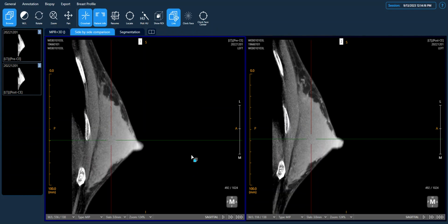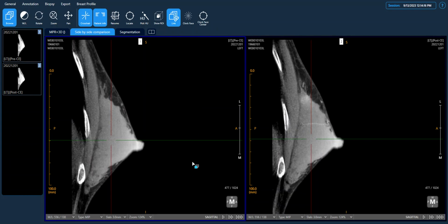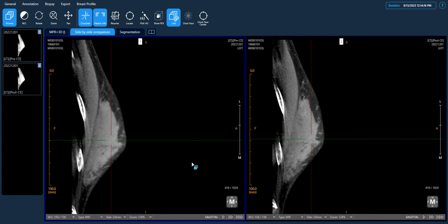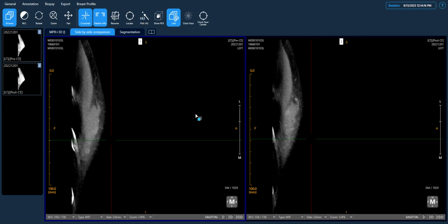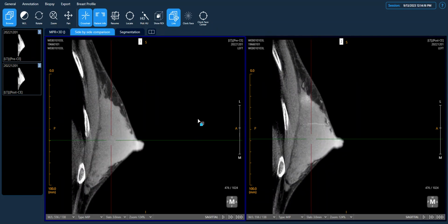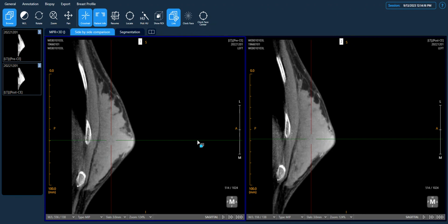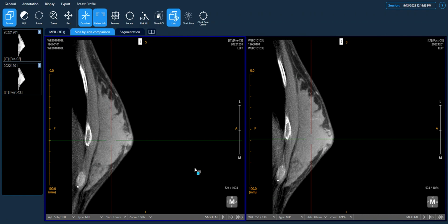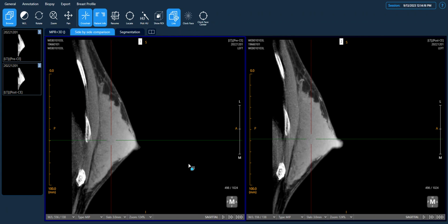As we move forward, we can observe that this patient has extremely dense breast tissue. For diagnostic purposes, especially in patients with symptoms and very dense breasts, contrast CT imaging greatly aids not only in identifying any suspicious findings within the dense tissue, but also in examining the extent of disease simultaneously.